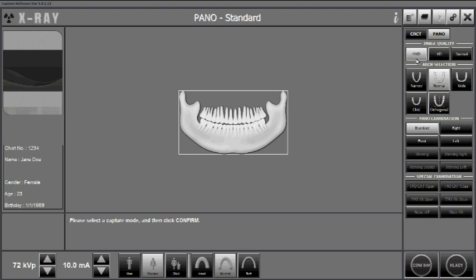Depending on which option you select will then make changes as far as the device as well as image quality. For instance, under normal, the exposure time is roughly 10 seconds. HD is roughly 13 seconds. UHD is a 20-second scan. The detail that you'll render within the image is also directly proportionate to the size of the image. For instance, normal will generate an image size roughly 1 megabyte, HD between 3 and 4 megabytes, and UHD roughly 30 to 40 megabytes in size.